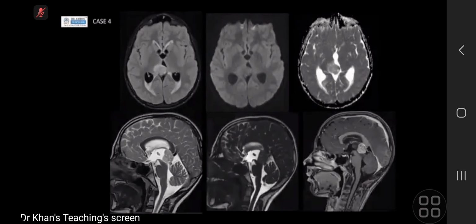And in the diffusion weighted image, I see the lesion doesn't show restriction. It's the same low signal. In sagittal T2, I see the lesion is localized to the region of the pineal body. In T2 FLAIR the same. In contrast, showing homogeneous enhancement. So I will be going with the pineal body tumor, pineoblastoma, as this one. Also as a differential from me, it is germinoma.